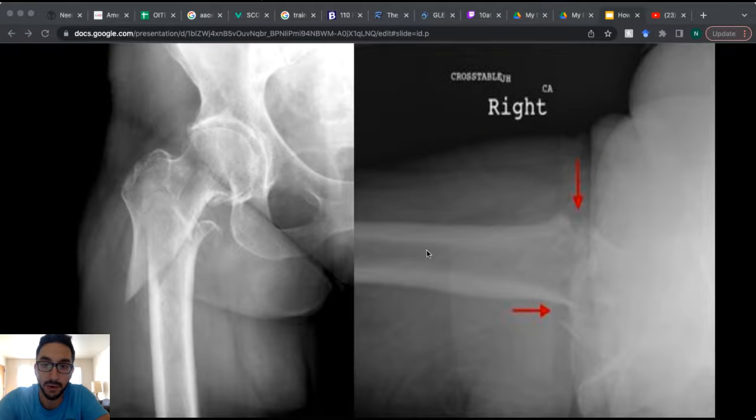So let's move on. I'll give you an example of a quick read here. And I just want to preface, I'm a medical student, I'm not an orthopedist, but I've chosen some simpler ones so that I can definitely get it right to give you an idea of how it goes. So I would read this like this. Here we have 2 views, an AP of the right hip and a cross-table lateral of the right hip in a skeletally mature individual, demonstrating an unstable intertrochanteric fracture with a reverse obliquity pattern, period.